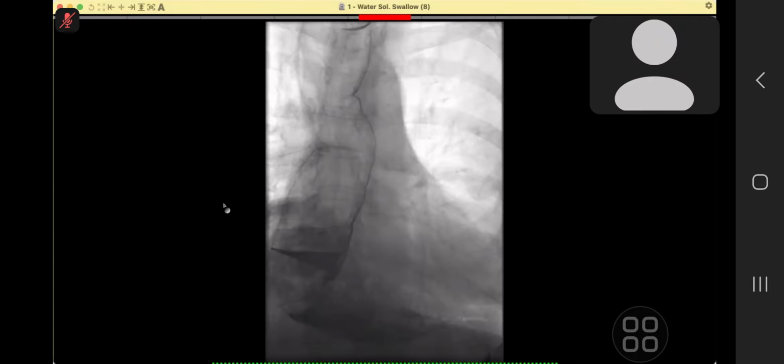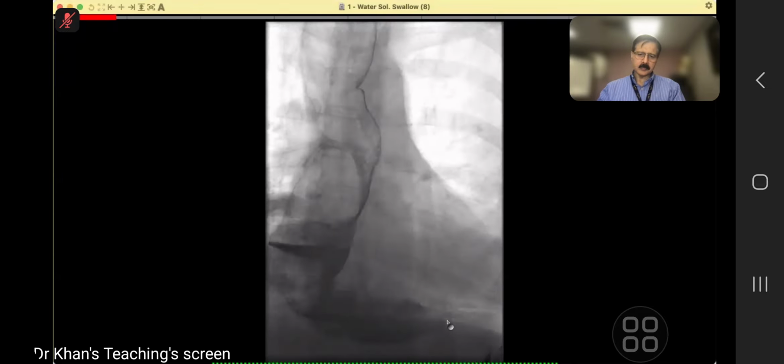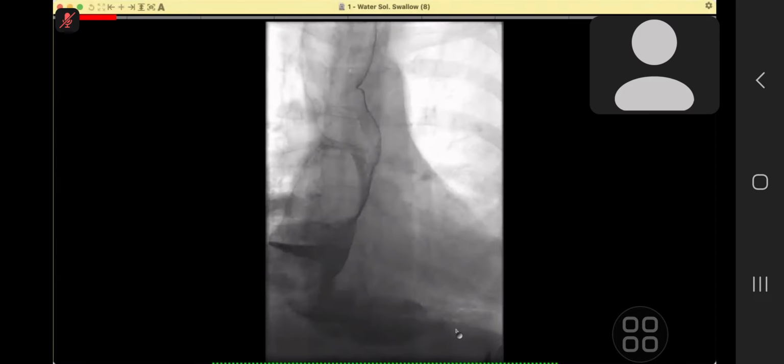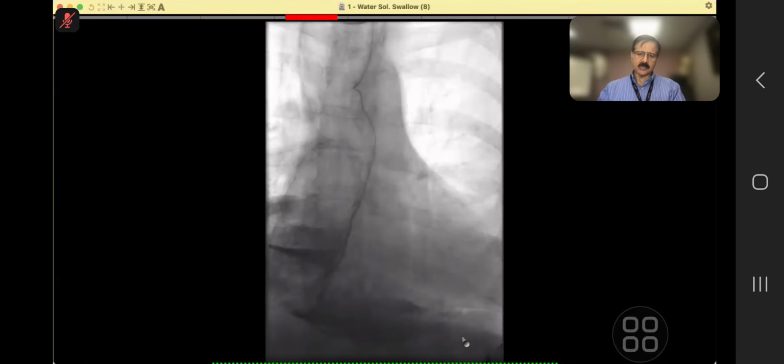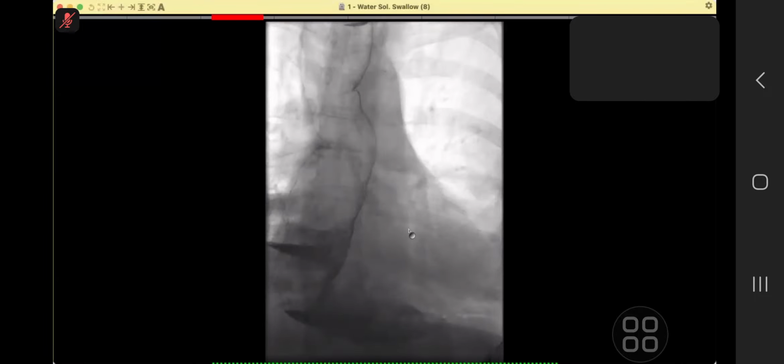The esophagus is dilated down to the lower esophageal sphincter. There is irregular narrowing, I'm suspecting. And is there narrowing here? It's not a very good quality film. Yeah, but having said that, there was no narrowing in this region, not at the lower end. Yeah, not at the lower end, but it is dilated.